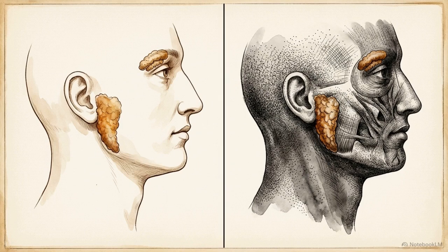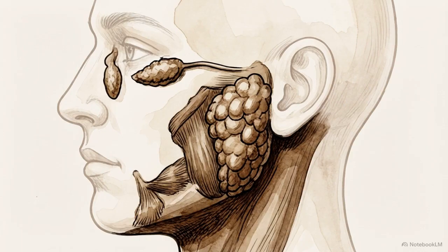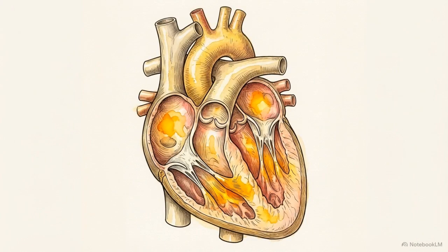Free technetium will also highlight the lacrimal glands, but it presents a distinct, messy background signature that immediately rules it out. Identifying a hot face on a scan means we are successfully tracking the body's acute phase inflammatory response via iron sequestration. Variable cardiac uptake on the no bones branch isolates the MIBG pathway.